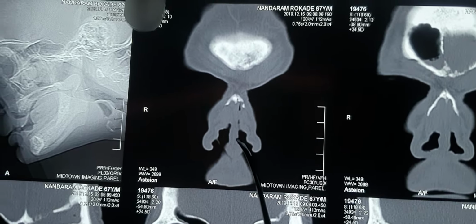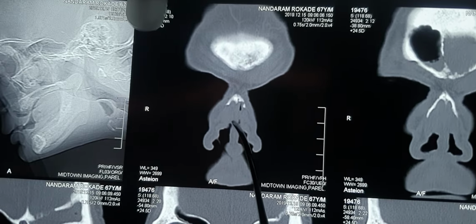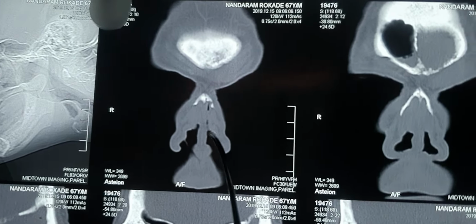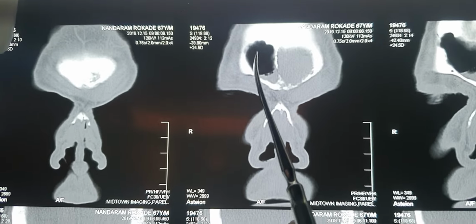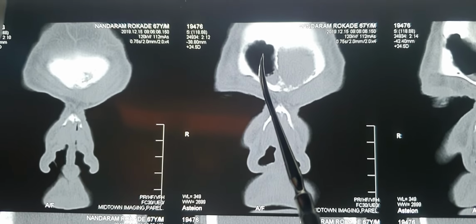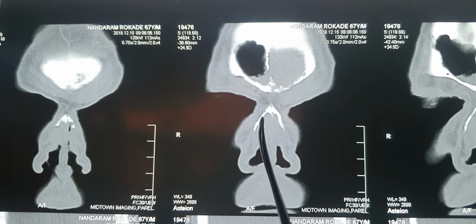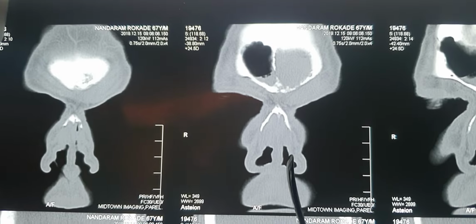This vertical segment you see is the septal cartilage, and these two lateral structures are the nasal ala. As you keep on going posteriorly, you can see the frontal sinus coming in the view, and this is the interfrontal sinus septum. So this is the right frontal sinus, this is the left frontal sinus, this is a nasal bone, this is the septal cartilage with the nasal nares.